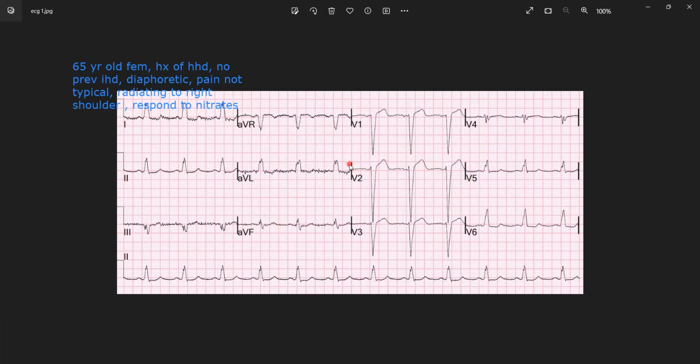Or number two, this was an acute ischemic event that was presenting as a new left bundle branch block. So given what we saw on the patient and given how she was presenting, my advice to the doctor was that we should treat the patient as an acute coronary syndrome. So this patient was then transferred. She went to the private medical facility in our area.